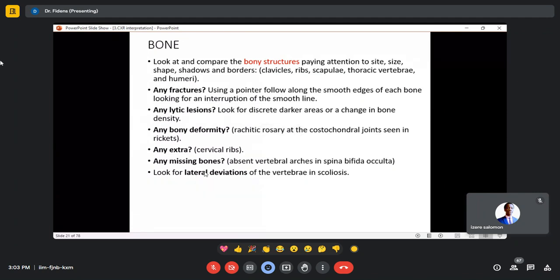So question, yes. So what is it? We didn't understand well. See, he has answered very well. A lytic lesion, it is when, for the bone, we are in the bone, and you see that there is an area that's darker than normal. You know, it has made the bone have some focal darkness. It's like the opposite of opaque, than normal in the bone.